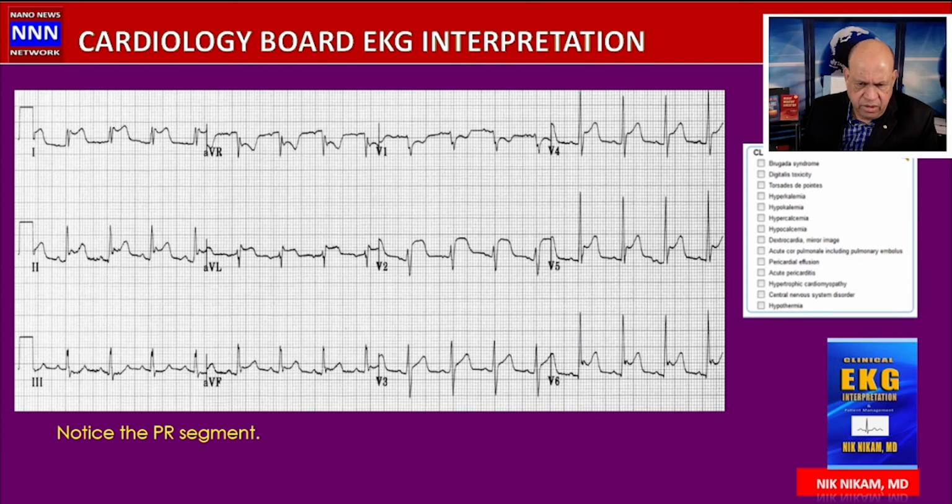All right, what do we have here? Oh gosh, this is evidence of significant ST elevation in multiple leads: lead 1, aVL, 2, 3, aVF, V1, 2, V6, along with more or less sinus tachycardia. So, what is this? What are the differential diagnoses? Is this an acute myocardial infarction? You can't be having a global myocardial infarction.